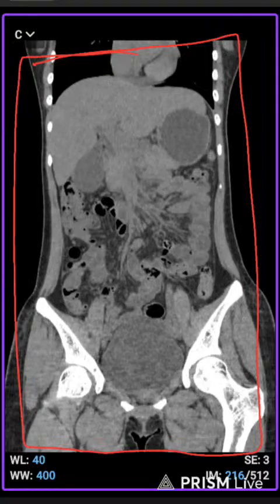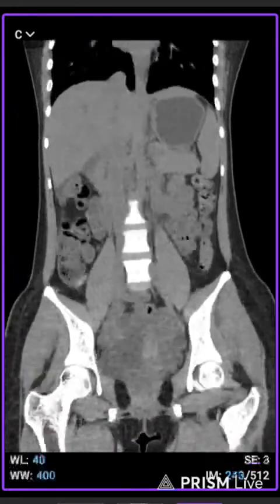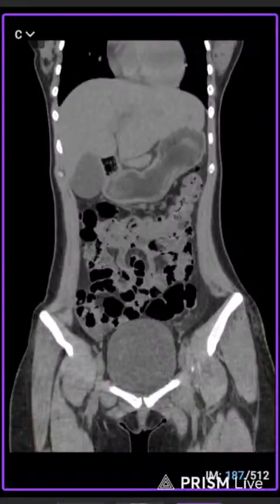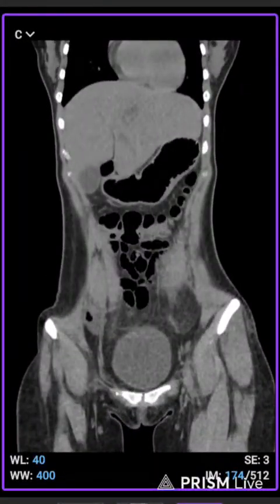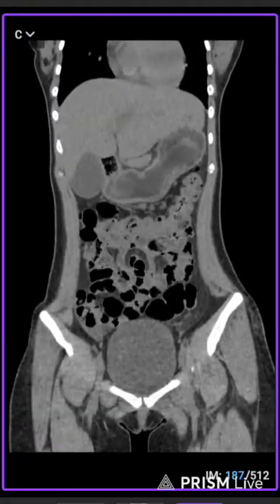The plain scan will be done. After that, you have to see whether there is anything different in this area. If you find any type of abnormality, it's good to do the scan, as it provides good information compared to the previous scan.